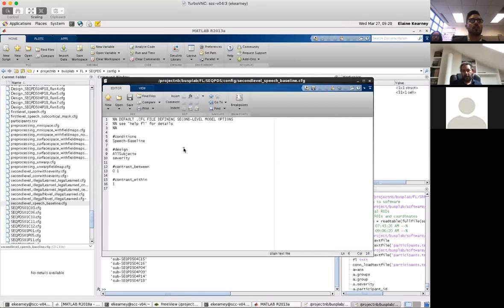And also, this is going to work just fine, but without... I was mentioning this before. Since we talked yesterday, I also changed the name. So instead of conditions, you can now use contrast names. You can still use conditions for backwards compatibility, so it's going to work fine. But in future scripts, if you want to use contrast_names, that's the new name for that field. And yeah, that looks perfectly fine. That should work. Okay, so let's give that a try if you want.